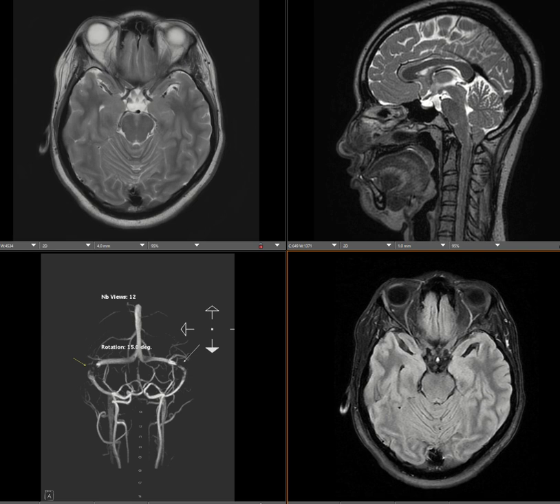Let's look at a patient in her 20s with headache. Recently, we have a very common diagnosis called Idiopathic Intracranial Hypertension, or IIH. So I just want to show you guys common manifestations or MR imaging findings of this entity.